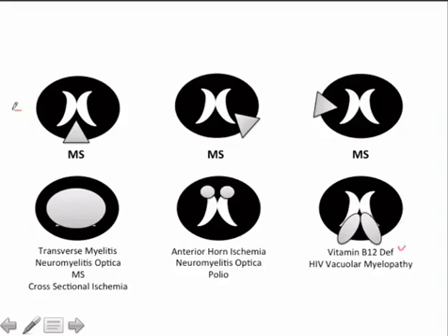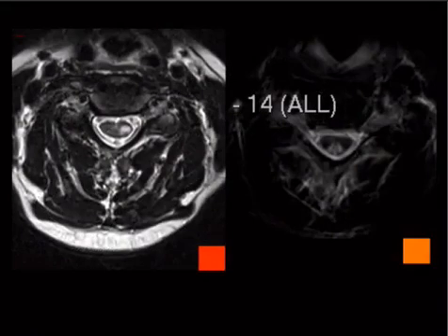Because I think this one's too easy, and I think this one's too hard, and I think this one's just right, like Goldilocks' porridge. All right, so next case, these are actual pictures, so think back in your mind, visualize those. What do you think the one in the red is?